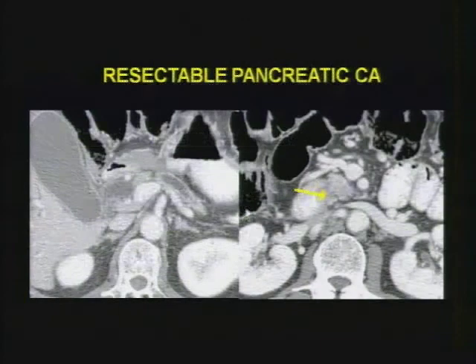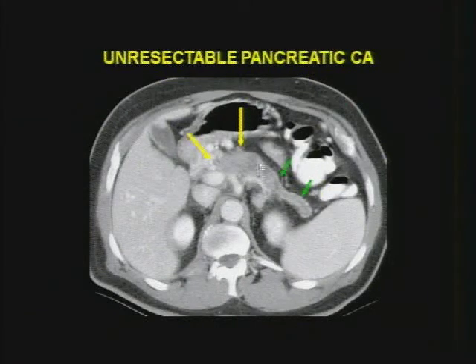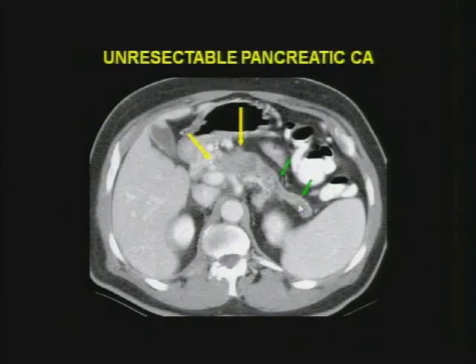So this is typically what we don't see, or is early stage pancreatic carcinoma. This patient presented early because he had double duct sign. You can see dilated pancreatic duct, dilated biliary tree, and it's all due to this tiny mass sitting in the pancreatic head, and this is resectable. This is more typical, where we have the larger mass. You can see atrophy of the pancreas beyond, and then dilated pancreatic duct beyond the level of the mass.